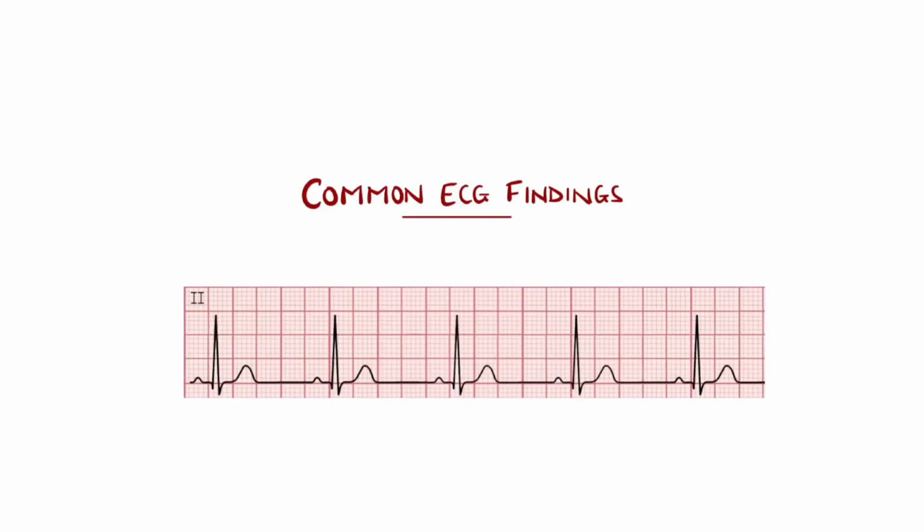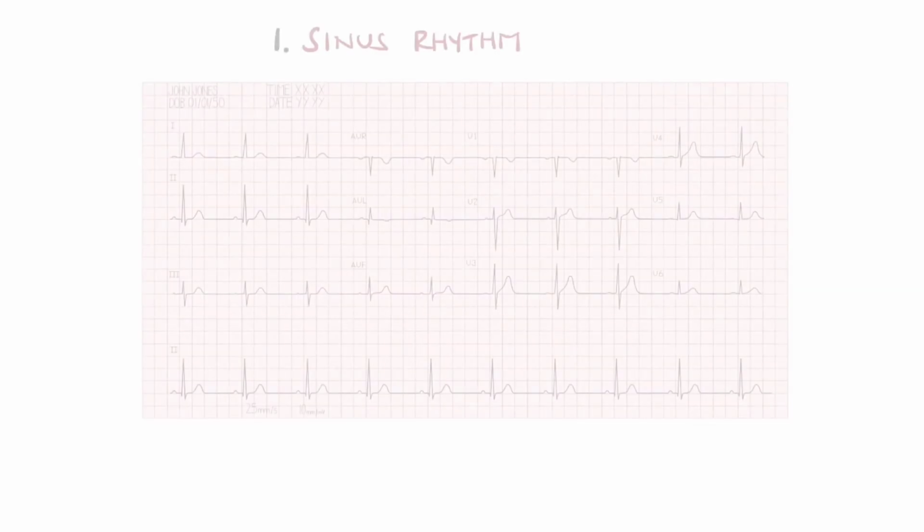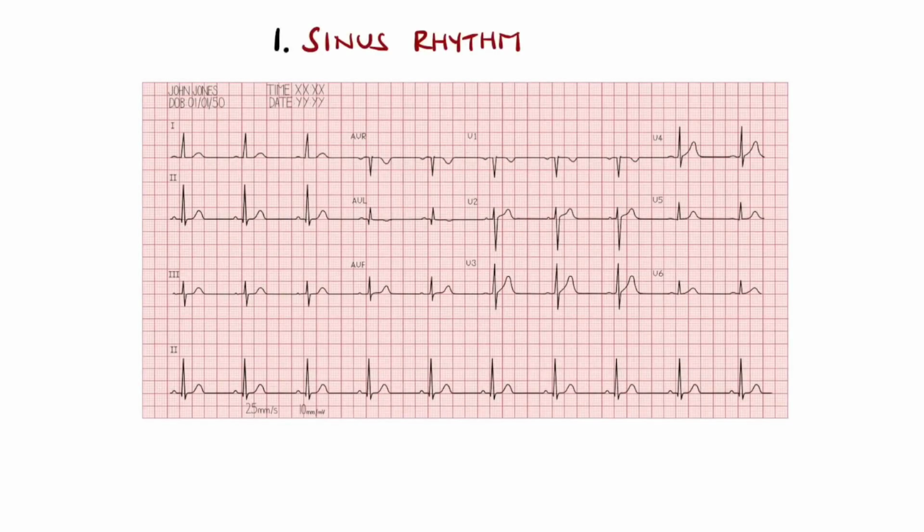In this video, we will look at some of the most common and must-know ECG findings in medicine. We start with sinus rhythm, the normal rhythm of the heart.